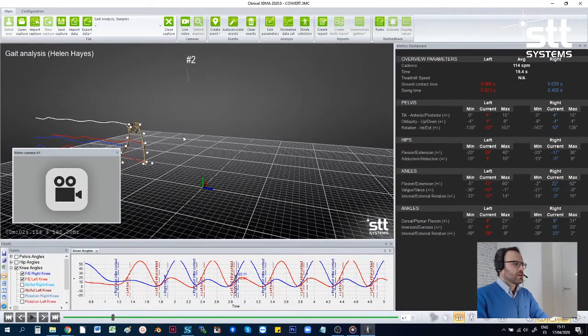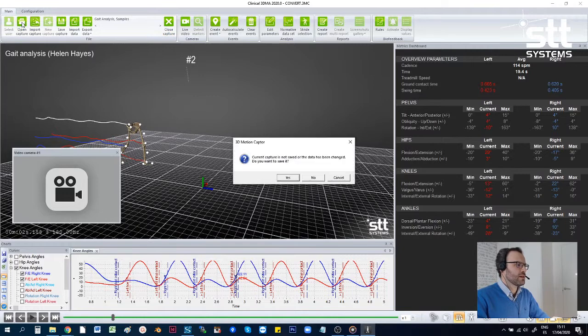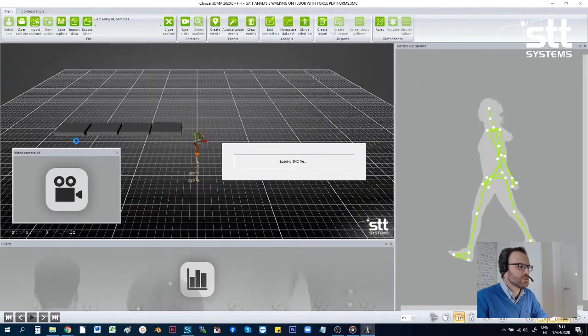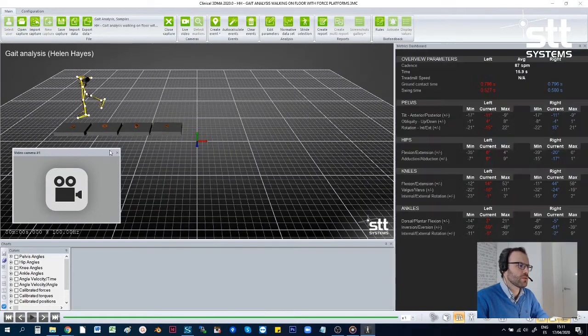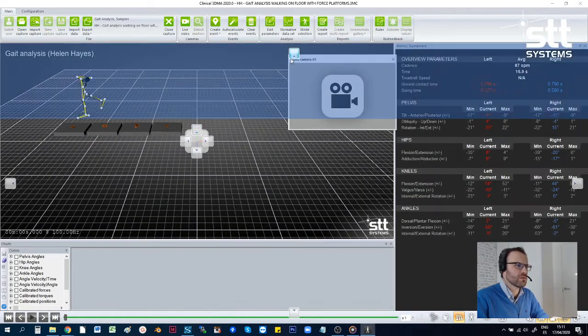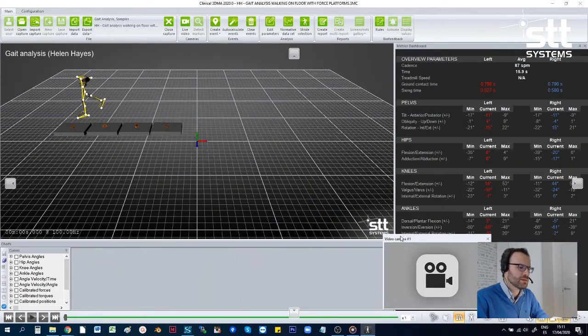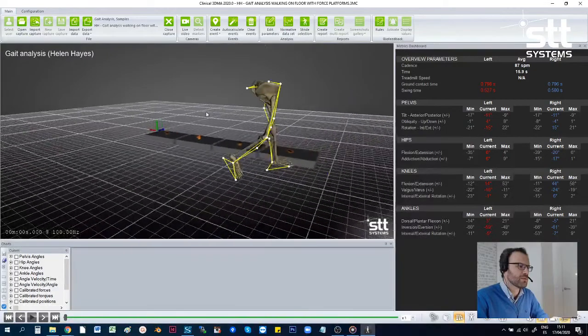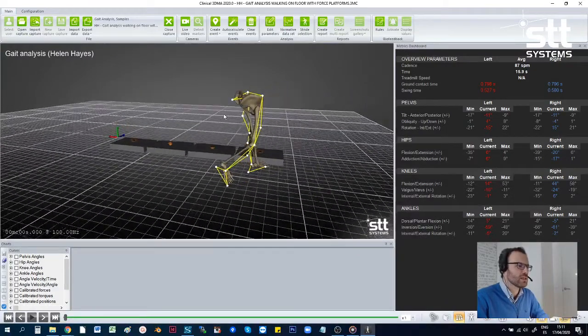One of the other major enhancements in 3DMA has to do with the force plate integration. So now we can integrate up to 8 force plates into 3DMA. That's quite powerful, and even though not many labs actually have 8 force plates, it is quite typical for many labs to have 1 or 2 plates.